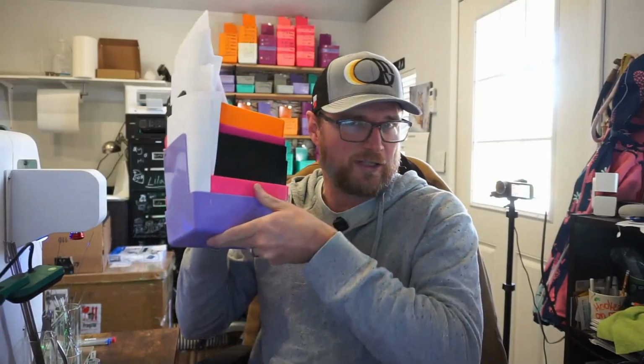And then the next day you download them or open up the file, make some tweaks, send them to the wire bender to bend. That's pretty much basically what it is. It's all built into the system. I've already uploaded some yesterday. I don't know if we'll get through all of these, but we'll go through a few of them. And I'll just explain it as we go.